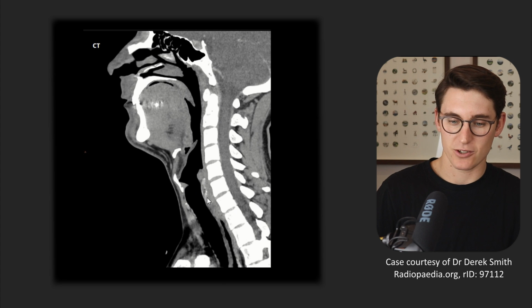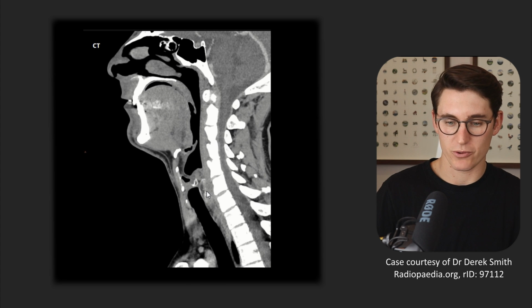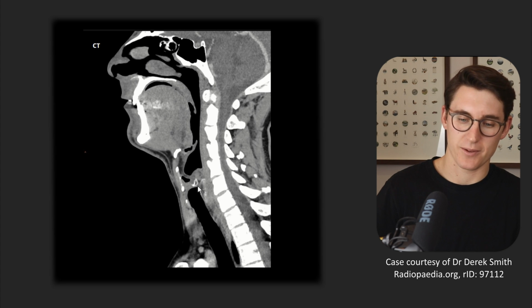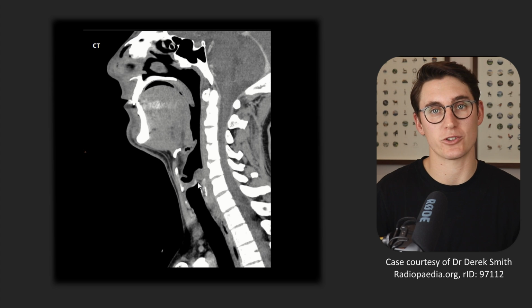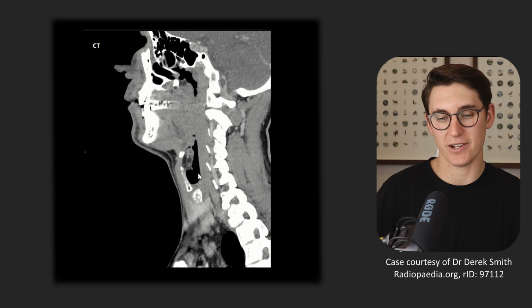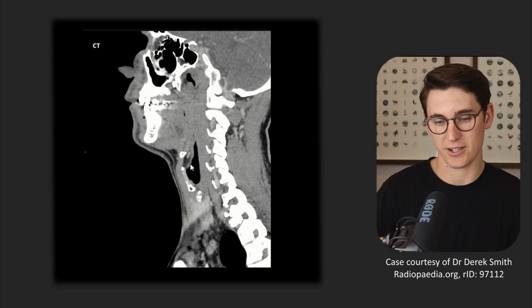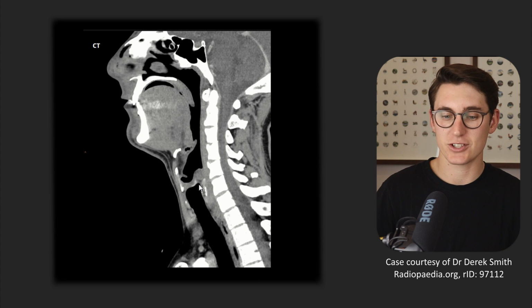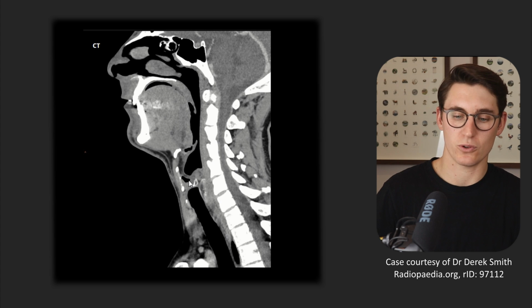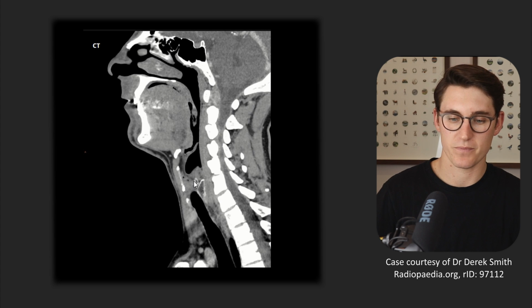You can see above the cricoid, we should be able to find our arytenoids. If I go slightly laterally, we can see our arytenoids there with our cricoarytenoid joint there. Our arytenoids will give off our true vocal cord across the larynx, as well as superiorly giving off this aryepiglottic fold that we see heading down here. If we head then to the midline, we can see our true vocal cord as well as our false vocal cord, that fold of tissue down separated from the true vocal cord by this laryngeal ventricle.